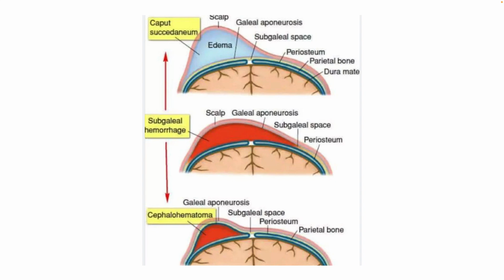I can understand that it might be sometimes difficult in the exams to differentiate this from this because both cross the suture line, but most likely they will give you an image where you can clearly make out whether it's blood or edematous fluid, and also you can make out whether the periosteum is the only layer below the collection or the periosteum and the galea aponeurotica are also there, because then it will be a little more thick and a little more irregular, whereas if it's just periosteum it will be a thin uniform soft tissue. Okay, thank you.